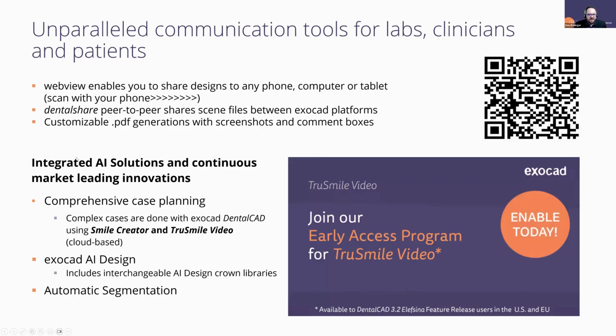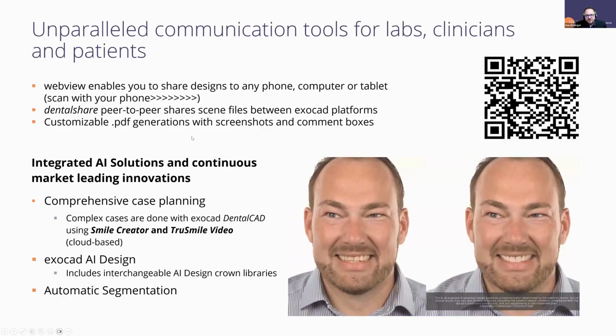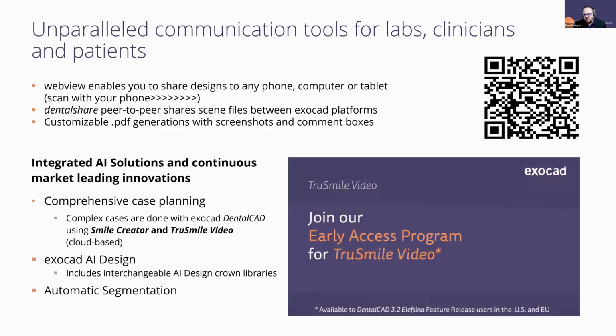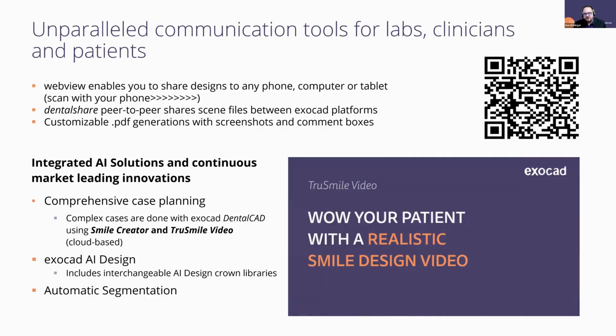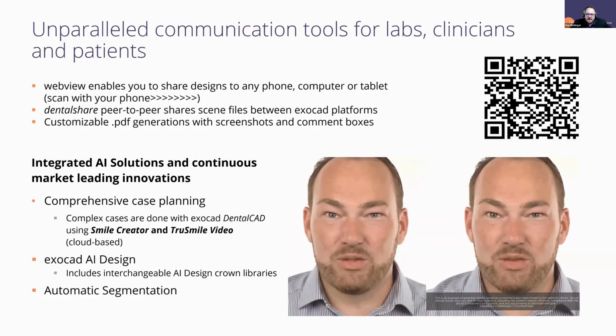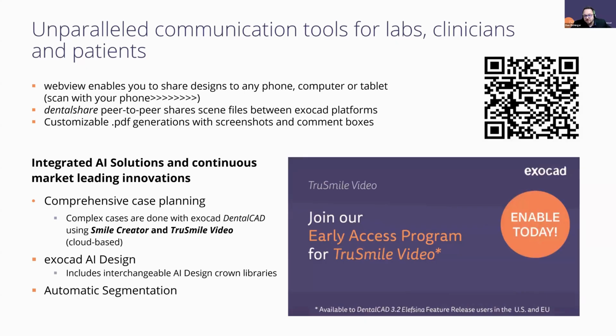And then there's also PDF generation. With our automatically generated PDFs, you're going to get a series of screenshots showing the specific viewpoints. So it's going to basically give those automated screenshots. And on top of that, we have a tool that allows you to add additional screenshots that you take yourself.